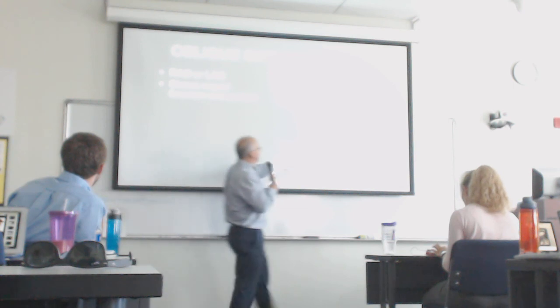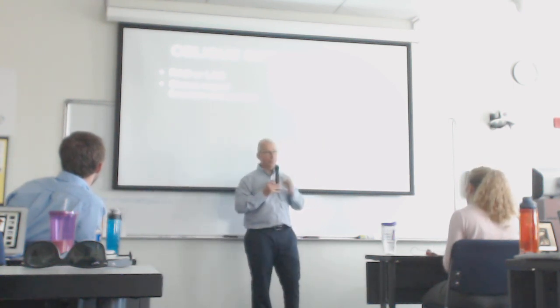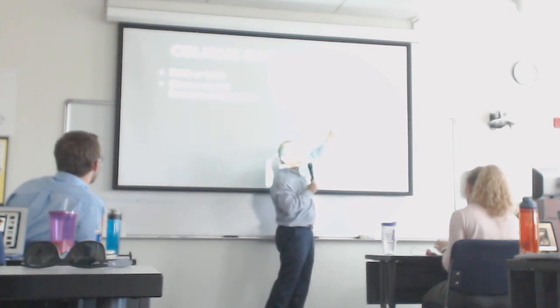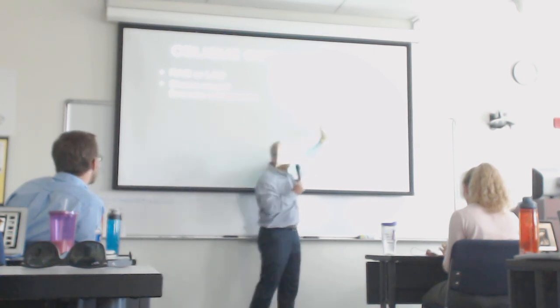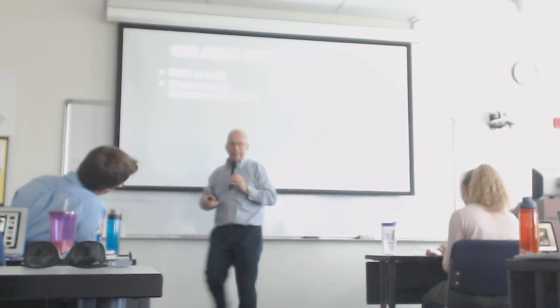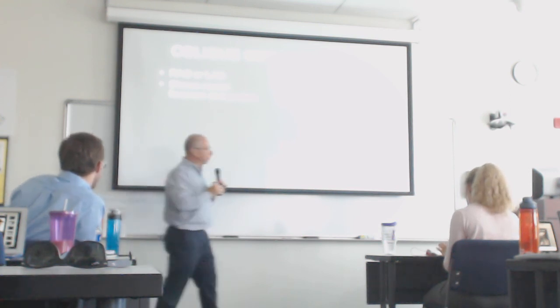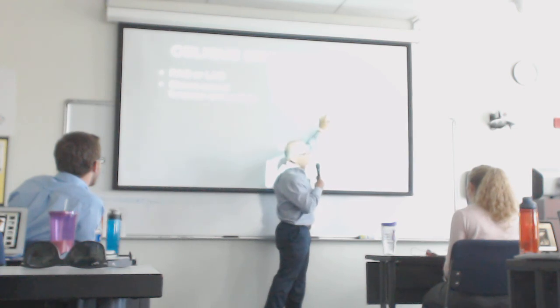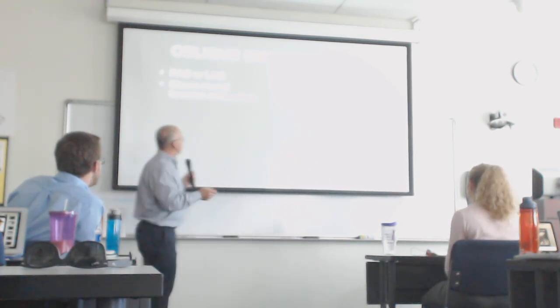We can create these images so that you can oblique the patient or oblique the tube, whatever you want to do, so that you can see the neural foramen, where the nerve roots are coming out. You want to be able to see how wide those are. If the patient has degenerative disease, there can be pinched nerves in the cervical spine. It's right here: when there's degenerative disease and that hole gets really small and the nerve is trying to get through it, it can be very painful.